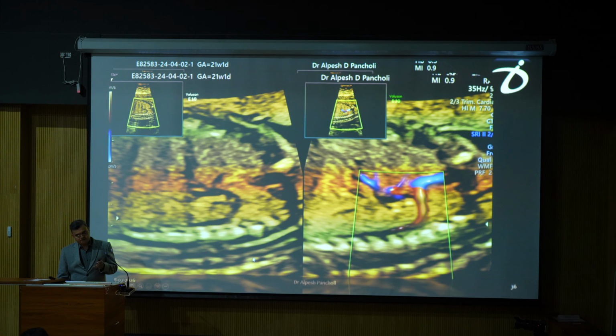So this is an example showing USS or the type 1 umbilical systemic shunt. Here the umbilical vein goes directly into the IVC. There is no narrow junction. Here the junction is wide open. Another example, the umbilical vein goes extrahepatically, going directly into the right atrium, and in rare cases it goes directly into the iliac vein. Here in these cases we find dilated IVC.